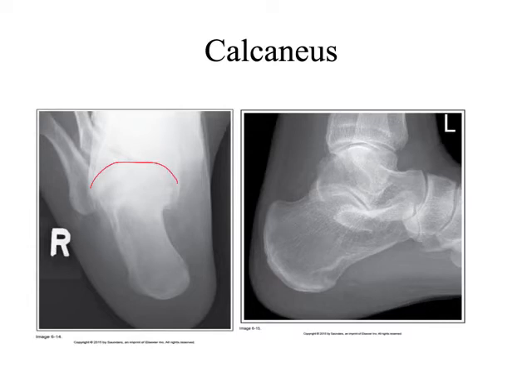In other words, do we have the central ray angled appropriately to that joint space? Angled like that. So we're talking about an angle of about 40 degrees, right? If I were to draw this on here and kind of indicate the angle that I'm talking about, an angle of about 40 degrees, right?